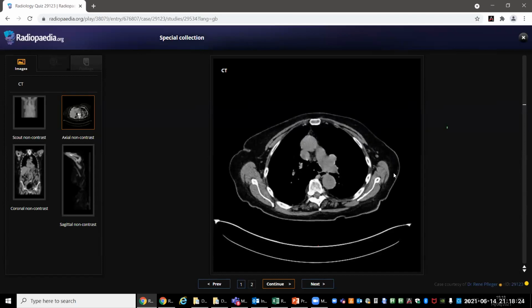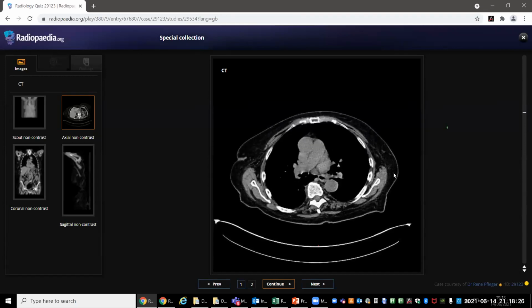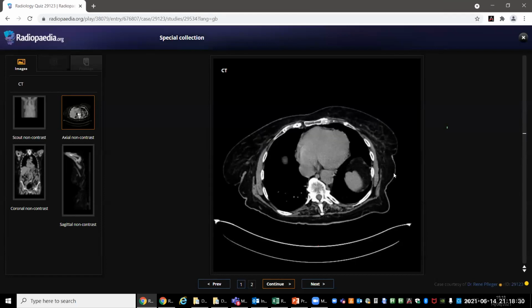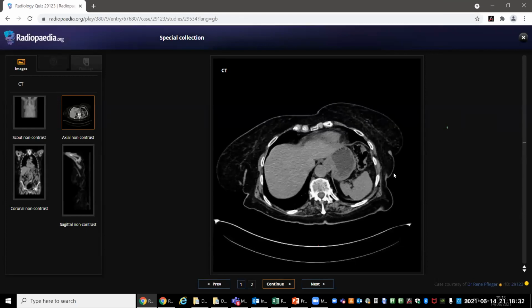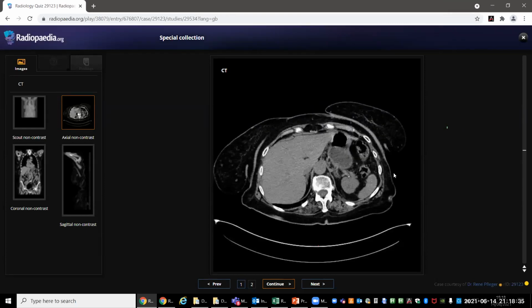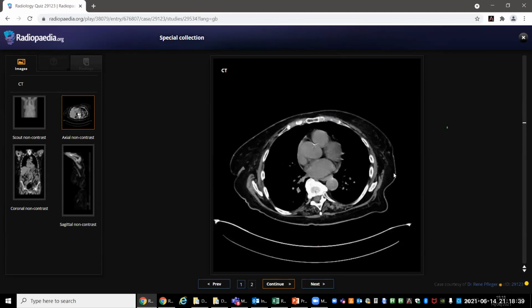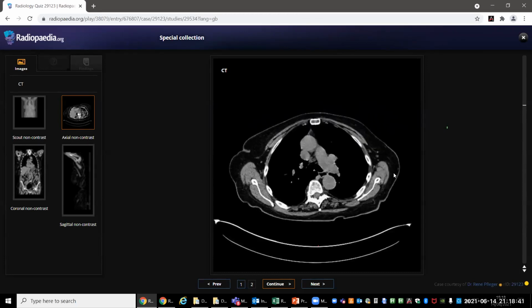In the chest, I can see that there is a, yes, ma'am. No, if you want me to stop, just tell me. That's why it's actually better you scroll yourself, so you'll be able to know where you want to look at very well. Okay, ma'am.